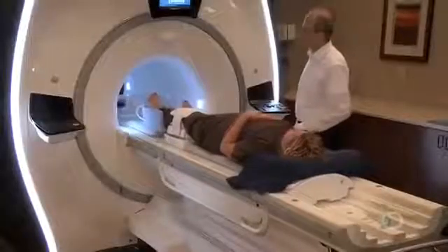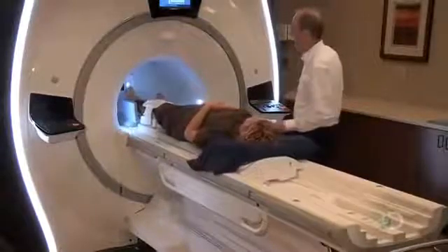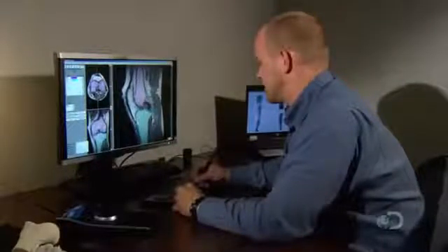So, starting with an MRI scan of the patient's knee, this medical device company produces custom-made surgical templates. Plastic devices the surgeon uses to sculpt the surface of the patient's bones to align the knee implant accurately. The surgeon no longer has to visually calculate the bone cuts on the spot in the operating room, which takes more time and is more invasive.